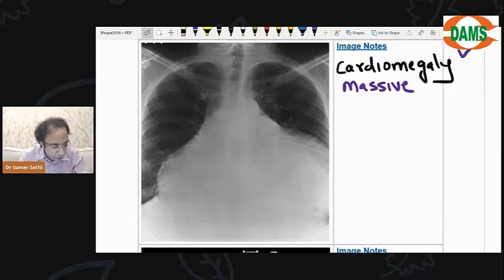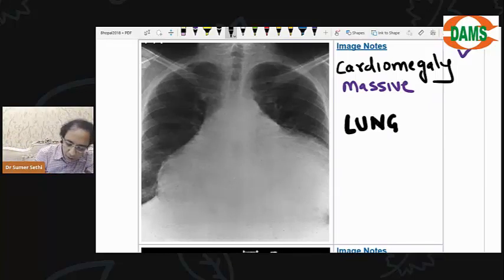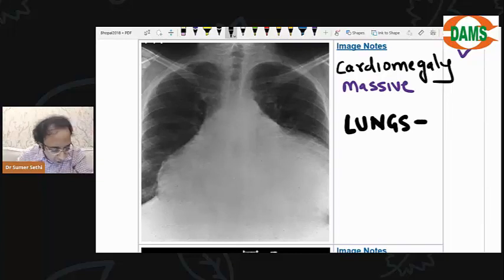Massive, बहुत बड़ा heart है, बहुत ही बड़ा है ना, बड़ा दिल है इसका, है ना? Let's see if you can answer better. Okay, anybody? Now, if you have a heart this big, suppose you are having a heart failure and your heart is dilated so big, या dilated cardiomyopathy आपको, या heart failure है, heart इतना बड़ा हो गया. Okay, तो lungs कैसी होनी चाहिए बेटा? एक बात बताओ, if you have a massively dilated heart because of failure or a cardiomyopathy, the lungs में क्या होना चाहिए? Do you remember, if there is a heart failure, the lungs should have edema.